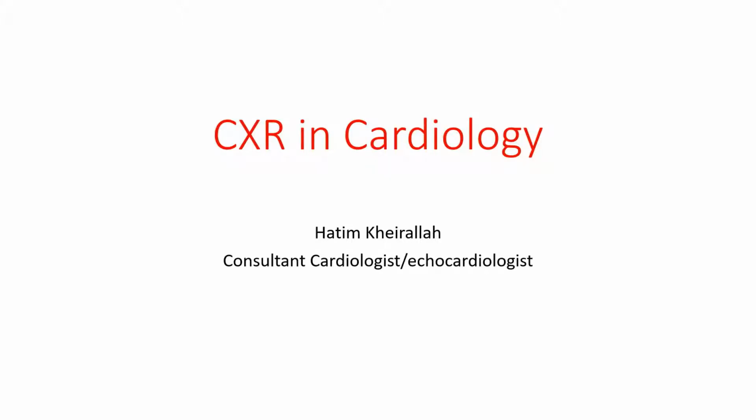But chest X-ray is still very rich as a diagnostic tool. I'm going to walk you through many chest X-rays in this session, their relevance to cardiology, and how we can read them. And as we always do, it's going to be an interactive session.